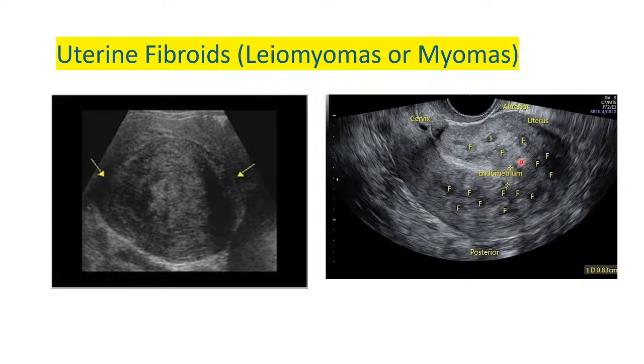The endometrium sort of disappears there, and then we have these ones. So according to me, this is diffuse adenomyosis. You can have fibroids which are small, but these are not fibroids, but diffuse adenomyosis. I need you to appreciate the sonographic appearance of those small tiny fibroids there.